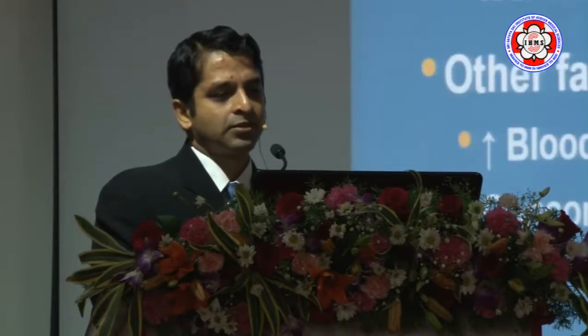A classic example: a patient has ischemic MR, the echo report says it's severe mitral regurgitation, but then a referring cardiologist listens to the patient and says, I don't hear any murmur. And that's because it's not a leaflet disorder. It's a disorder below the mitral valve leaflets. And again, the grading is completely different. So this is a point that I think is often being missed. It's probably more appreciated nowadays, but again, it's important to remember that the grading is totally different.